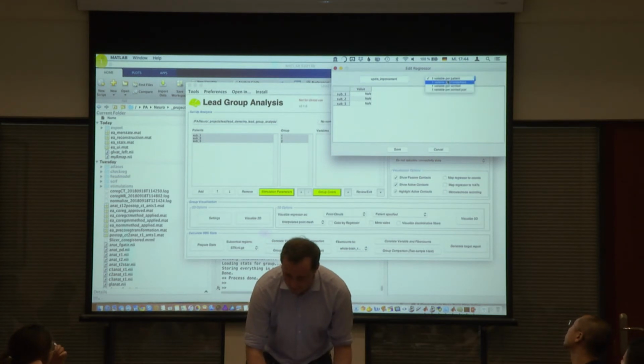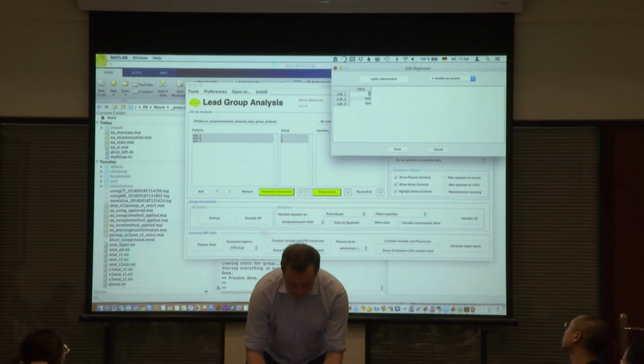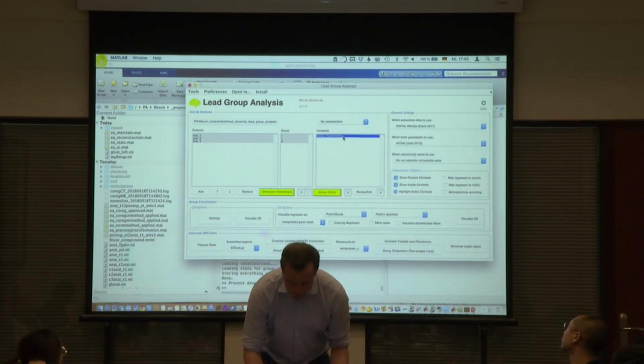Here we could say one per patient, one per hemisphere, and so on, but we stay with one per patient for now. And let's say the first patients did not do well, because they're outside, we know that, so 0.1, but maybe the third one did well. 80% improvement. Incredible. And okay, let's hope this works.